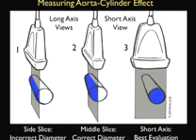This illustration demonstrates that there are pitfalls in measuring the aorta in a long axis orientation, and that a better orientation is to place the probe in the short axis configuration to get the best evaluation of the diameter of the lumen of the aorta. Let's take a look at the images here towards the left, the long axis orientations of the probe onto the aorta. In probe position 1, we can see the probe positioned along the long axis of the aorta, but notice that it's slightly over towards the side. Thus, we have a side slice, and we're incorrectly measuring the diameter of the abdominal aorta, getting a less than true normal value.